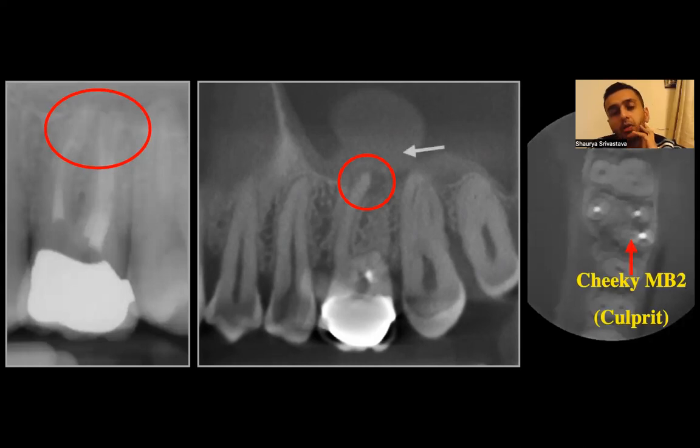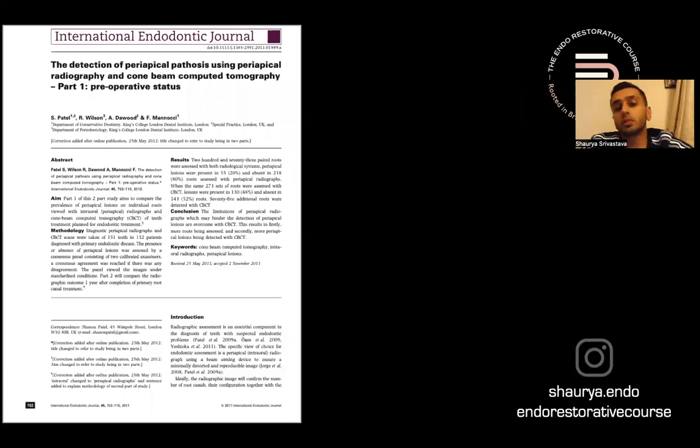And apart from that, just look at the thickness of the sinus membrane as well. The patient has some amount of sinusitis too. And I'm pretty sure if we do the endo and the lesion heals, that sinus membrane will also resolve itself. There is a CBCT study on that as well, that there's about 90% resolution of your sinus after doing your endodontic treatment.